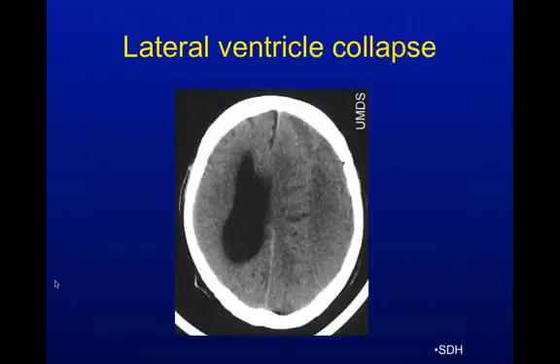All right? Lateral ventricle is collapsed. Okay? It's clearly not symmetrical. Why is that ventricle collapsed? Look hard. Yeah, some folks are saying it. Look closely here. There's a line right there, and everything here is kind of a uniform gray, whereas here is kind of the normal gray matter with some gyri in it. This is a huge subdural hematoma, gigantic subdural hematoma. It's isodense. It looks the same density as brain. This one's easy to miss if you're not paying attention. Okay, it's like, oh, wait a minute, where's the ventricle? And what's happening? Something has to be making it collapse. Okay, that clues you in.